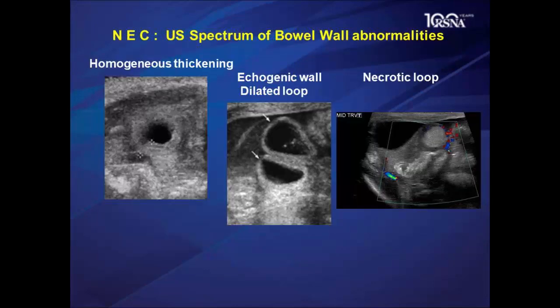Now let's focus on the bowel wall itself. One would think of the thickness. Here it's thickened, it's homogeneous. We don't see the echogenic layers of the mucosa, submucosa, muscularis, serosa, but it's homogeneous, thick edema. You see the surrounding mesenteries edematous. Versus the bowel loops are dilated, but the wall tends to be thin. So thinning is not a good sign, especially since here the fluid is in the peritoneal cavity.